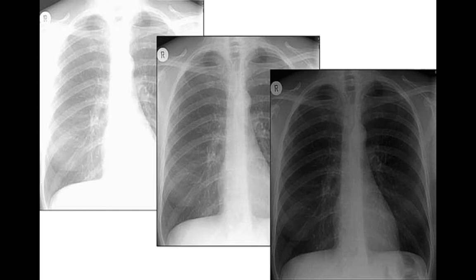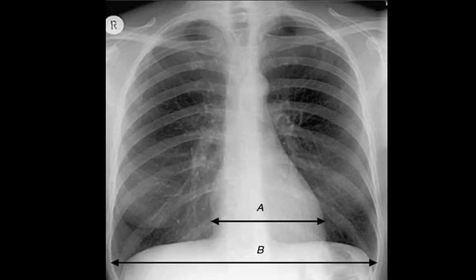Even the lower thoracic vertebral bodies sometimes should not be viewed in a plain chest X-ray, but the upper vertebral bodies should be seen clearly. So this is very important, and there are some cases of paravertebral soft tissue shadows, as you know. This is quite important for evaluation, and you will not miss it, I think.